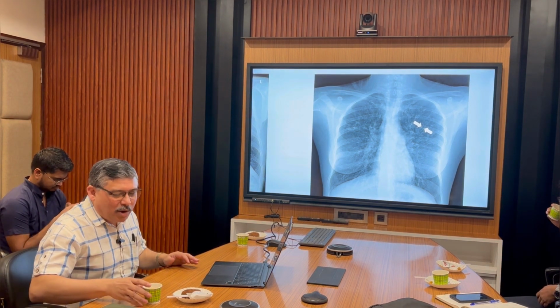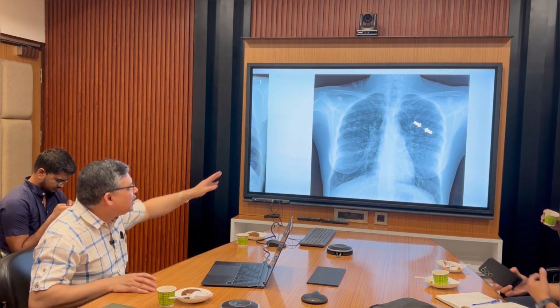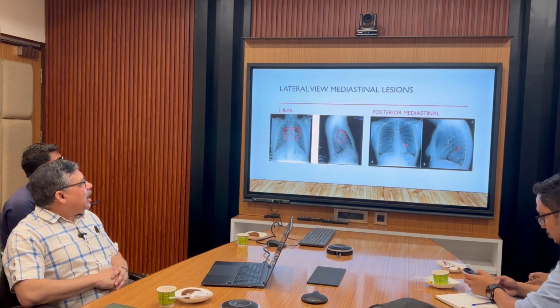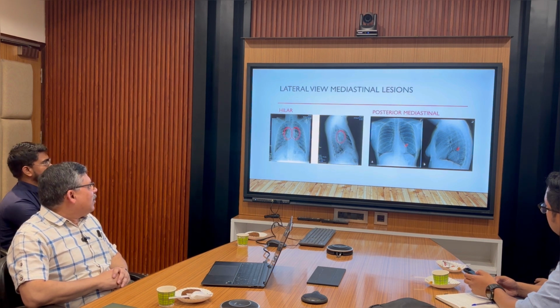There are so many bronchiectatic X-rays which are very visible, but this is something which you might miss. Let us go to the lateral views a little bit.